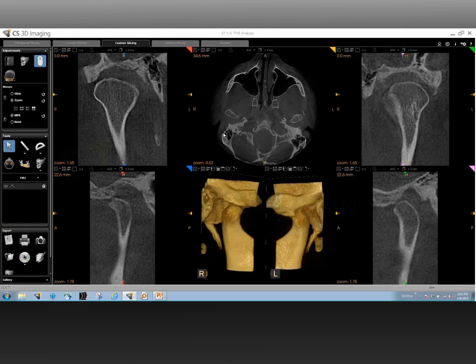Let us start with the condyle first. So this would be the lateral pole of the condyle. When you look at the anterior-posterior view, the lateral pole is the outside edge of the condylar head. Let me just do this real quick. What you see over here, where my cursor goes, that's the outside edge of the condylar head, and that is the lateral pole. And the inside edge is the medial pole. And the same applies for the contralateral side as well. You notice that is the lateral pole, and the medial pole is the medial edge of it.